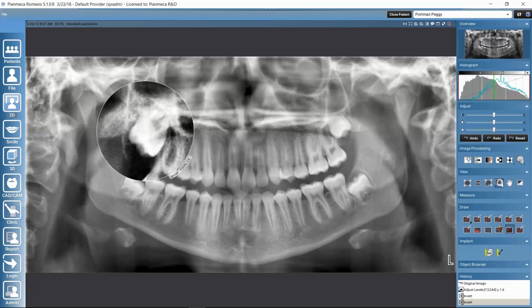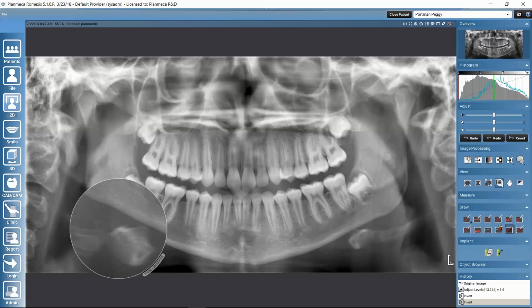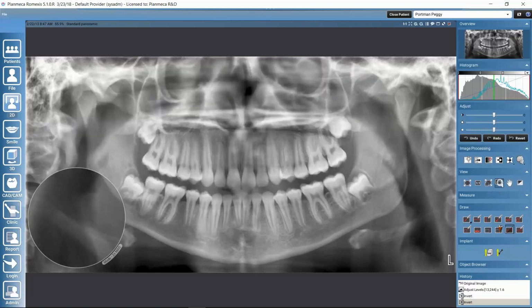So maybe we would like to simply apply a different filter to see different kind of details on separate parts of the image. So that's practical for that. This is pan rating tool, so we can just pan the image on the screen.